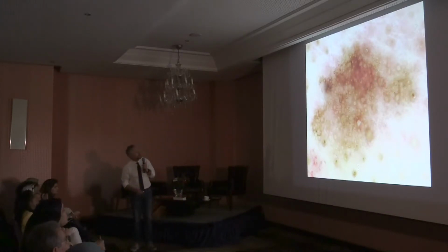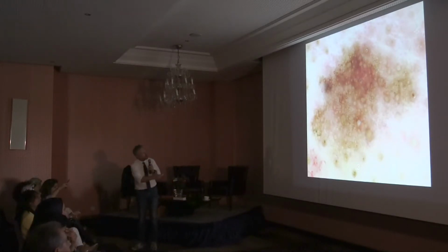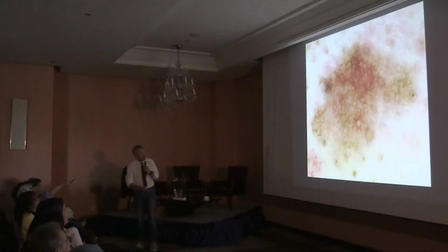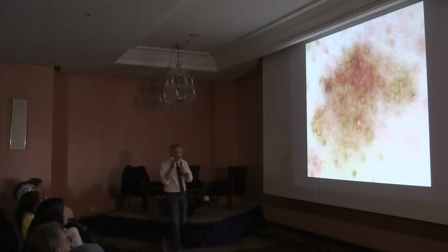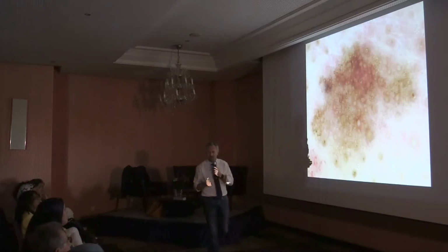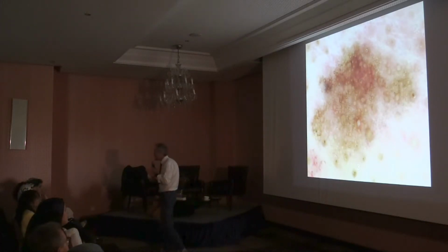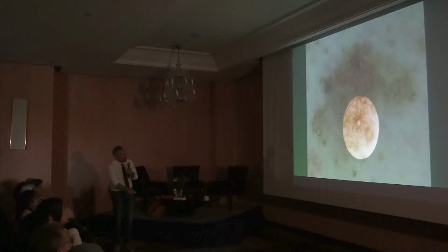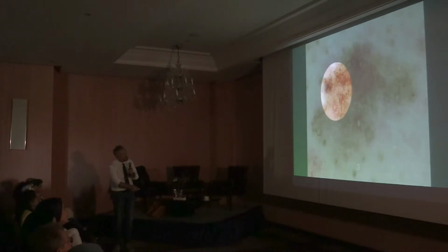I understand that you see gray color, especially in this area here, but my question is, do you see benign features? White follicles, but they're not white. They are follicles, but not white. This is a white follicle, but these are not white follicles.